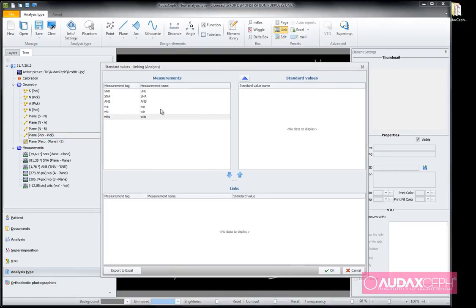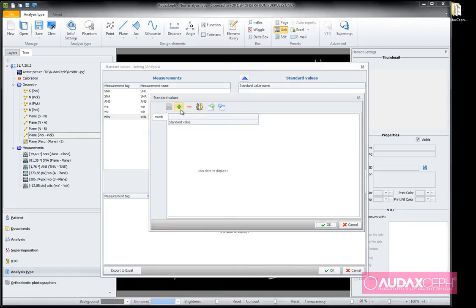So I have here measurements, and what I have here is a table where I can add different patient types, a child with, for example, mixed dentition, or deciduous teeth, or adult teeth, or whatever, and I can add different measurements into a table.